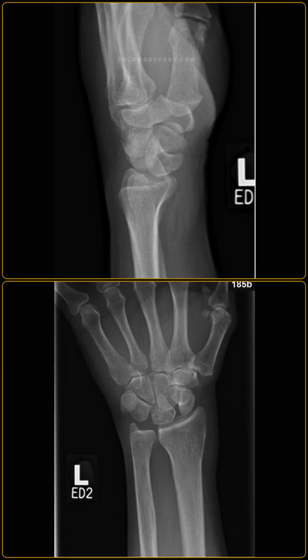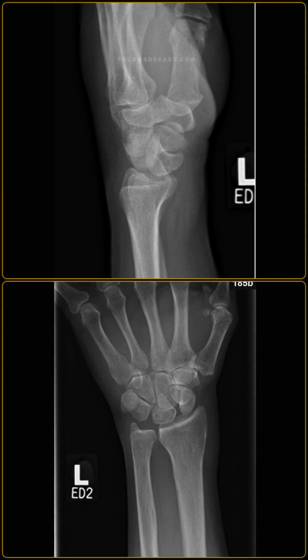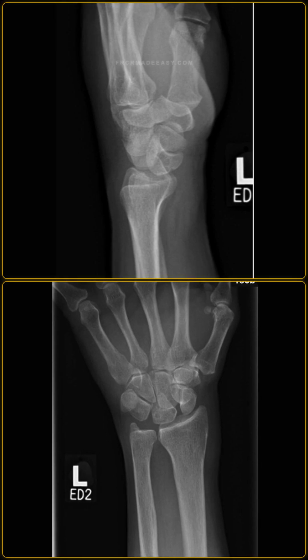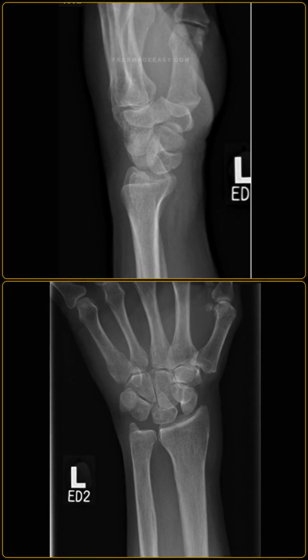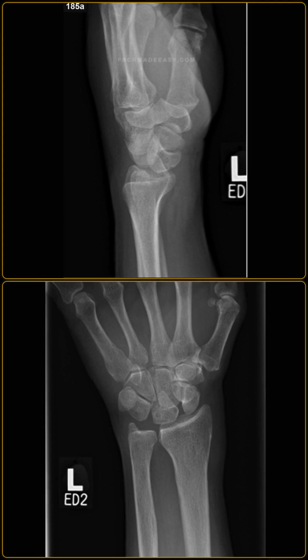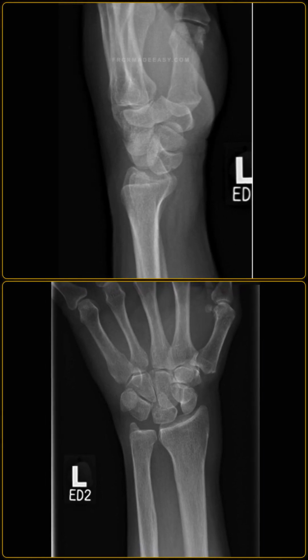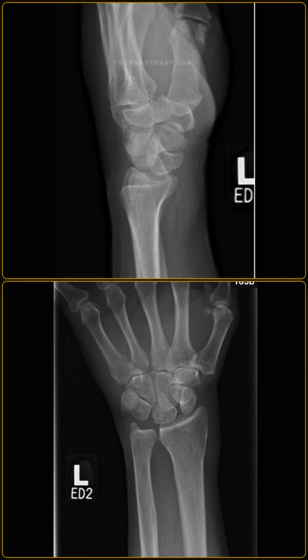On the lateral view, the volar dislocation and rotation of the lunate resembles a spilled teacup, which is the spilled teacup sign. The radiolunate cup is tilted forward, and the capitate sits behind it. It is critical to carefully interrogate the scaphoid for a waist fracture or rotatory subluxation, which can present as the signet ring sign, representing a transscaphoid perilunate or lunate dislocation.